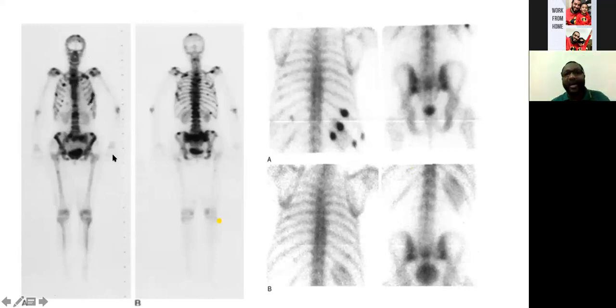Now, on the other hand, I'm showing you on the next slides how trauma looks in the rib. Now, traumas are usually focal, and they usually affect the costal rib, because the costal ribs are the sites of preference to trauma, because at the costal part of the rib there are no significant muscles, so those areas are more susceptible to trauma. So trauma usually is focal, rounded, intense, and the lesions are arranged in linear fashion.